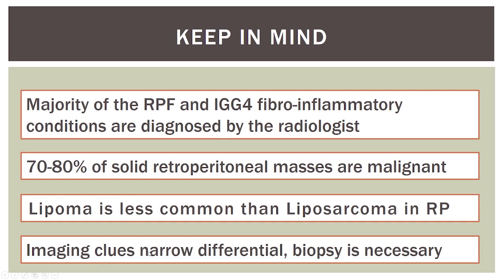And these are the imaging clues that we gave you just to narrow your differential diagnosis in the report. However, biopsy is needed in majority of these cases.